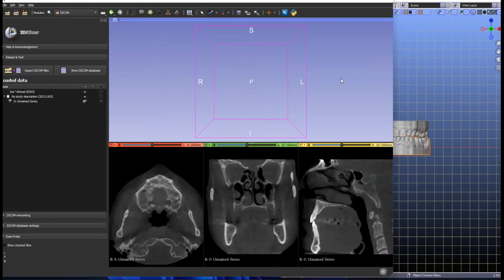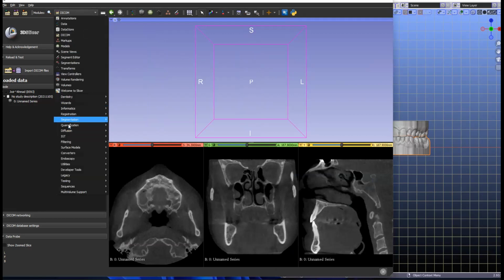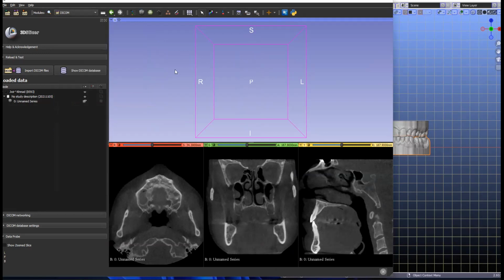So in 3D Slicer, we've got two add-ons. One is, if you look here, dentistry, the Slicer Blender link. There's basically only one button that you need to know. It's just connect. And the other one is Slicer Pano. There's quite a bit going on over there. Anyway, so let us make a model.